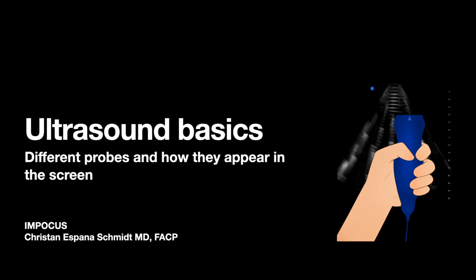And today we're gonna talk about ultrasound basics, something very basic: how different probes appear on the screen. So this is just for you to understand what you are seeing on the screen if you are just starting this journey.